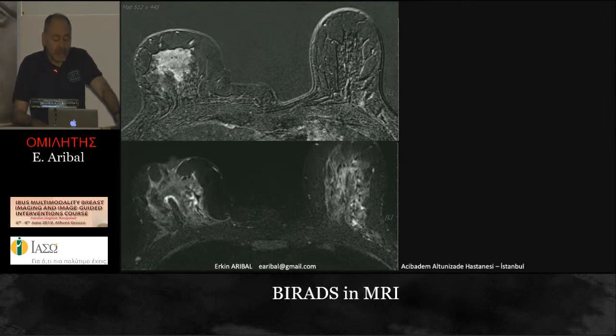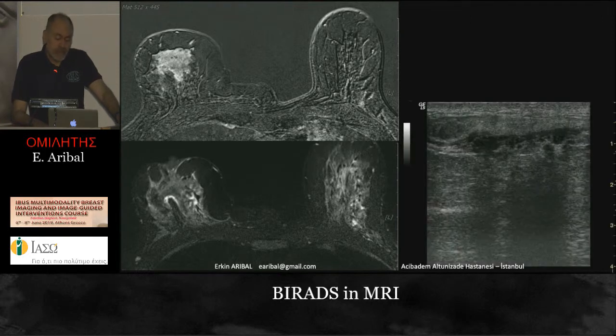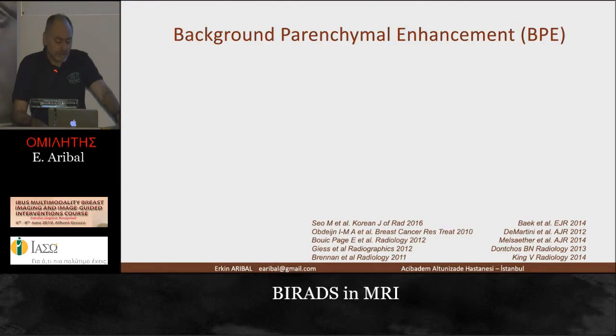When you look at the other breast, you see that fibroglandular tissue is bright, but here it is almost hypoechoic in some areas. So it's a lobular cancer which does not form any masses, but may look like a parenchymal enhancement. When you have the ultrasound image, it's still the same. You don't have a definite mass. It's only a hypoechoic region with some acoustic shadowing.